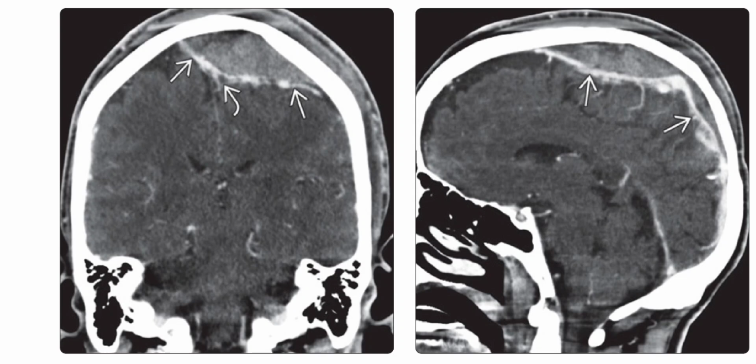Right is the sagittal CTV, which is nicely showing the expanding vertex epidural hematoma, which now appears to have two adjacent compartments. The venous epidural hematoma was evacuated at surgery, and the torn, partially thrombosed superior sagittal sinus was repaired.